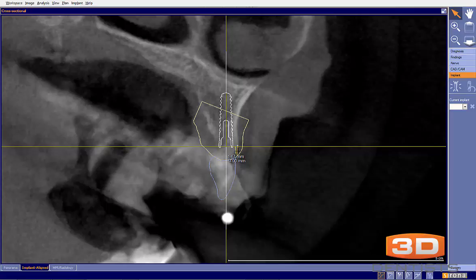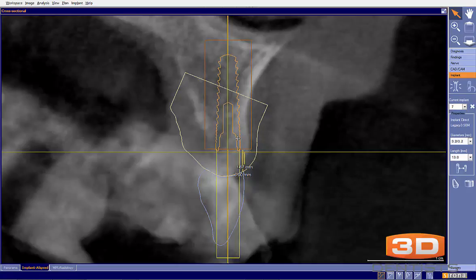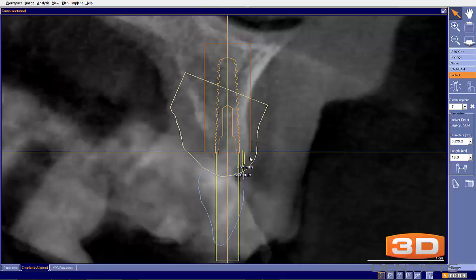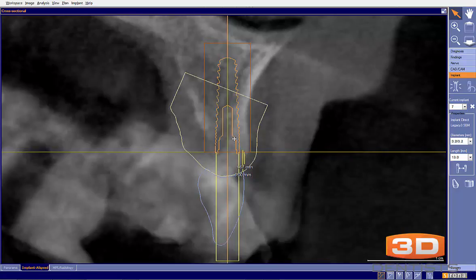Based on this data right here, there would be a 3 millimeter mark for our implant, so our implant would need to be placed right there from a 3 millimeter perspective. With just a minor correction of where you put it, I would say right here would be about right. You were pretty close, just a little bit more apical placement.